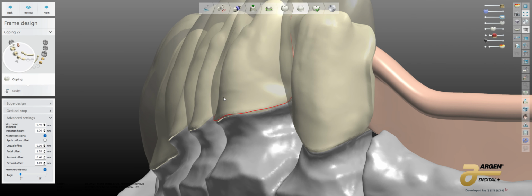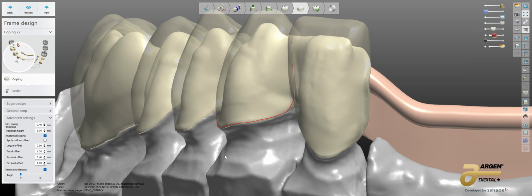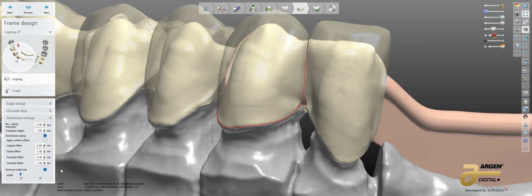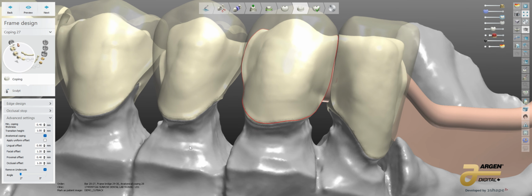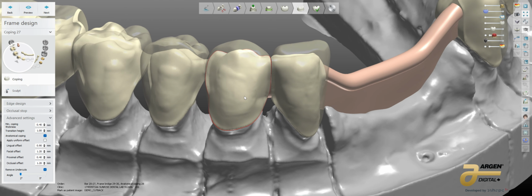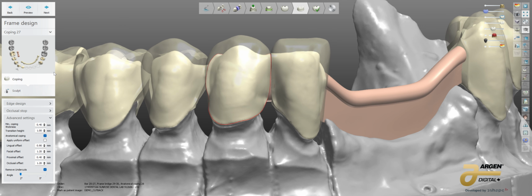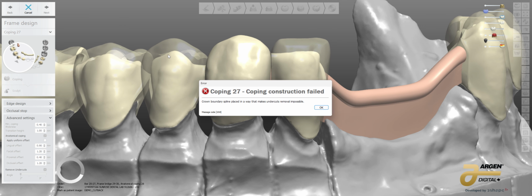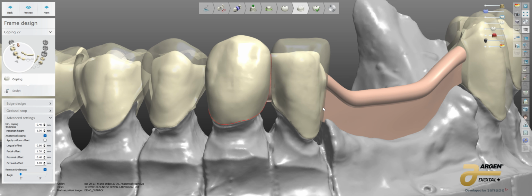You can see right now in this element, it has a belly to it, right? Well, if you were to produce the top cap in zirconia, it would never draw to that, no matter how much offset, within reason, obviously. If you had a ton of offset, you could get it to be loosey-goosey on it. So I'm playing with fire here. I'm not sure if these settings, the way they are, are going to allow this to produce, but let's see if it would. So let's just say preview. Let's see if we can get through this. Nope. All right, that's no good.